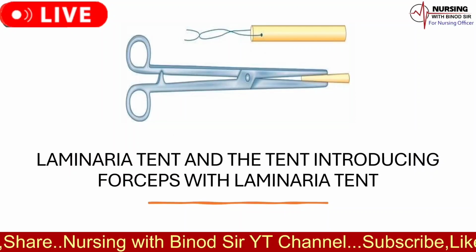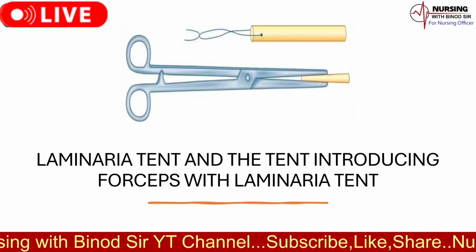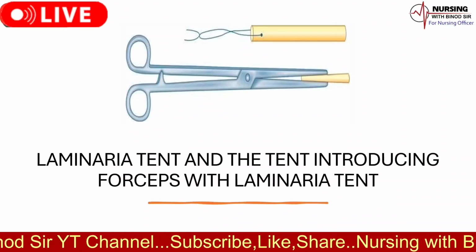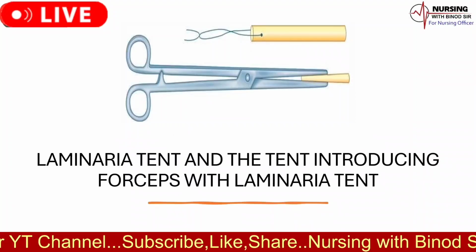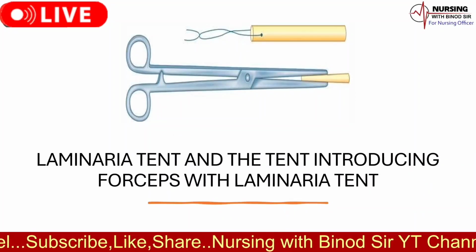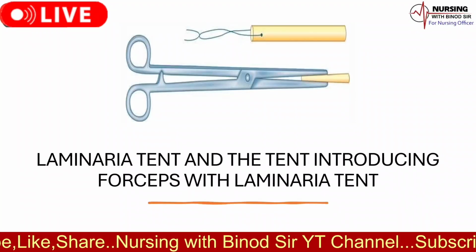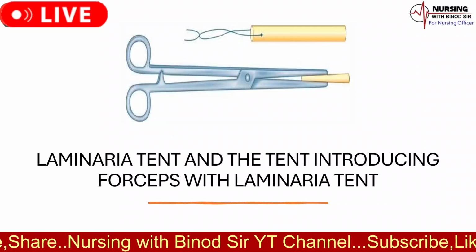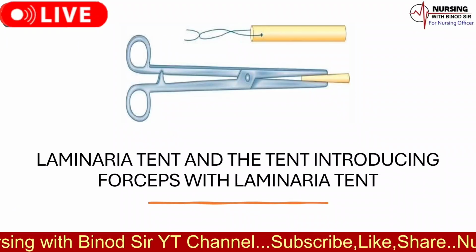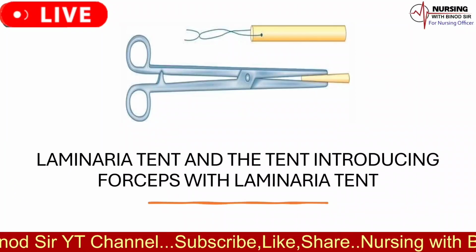Tent introducing forceps. 1. Insertion of laminaria tents. These specialized forceps are used to accurately place laminaria tents within the cervical canal. 2. Secure handling. They provide a firm grip, ensuring the laminaria tent is properly positioned without causing trauma to the cervix. 3. Minimizing risks. Helps in minimizing the risk of infections by providing a controlled and sterile means to insert tents. 4. Multi-step procedures.